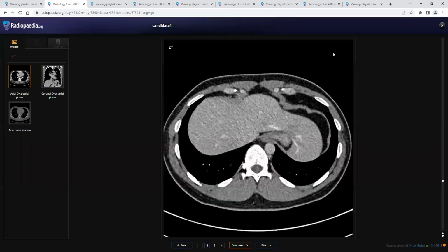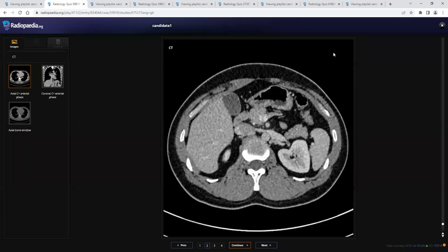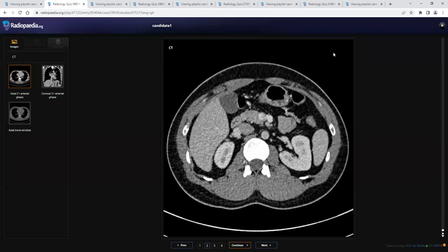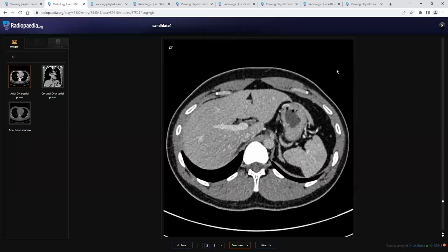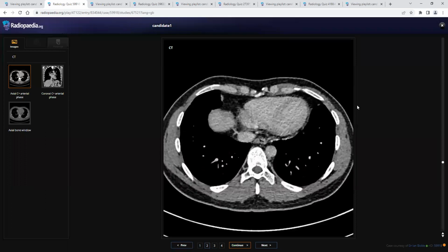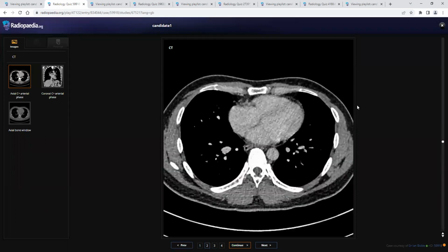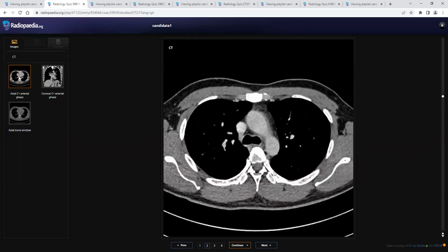In this case, there is no evidence of splenomegaly, the upper abdominal cuts appear unremarkable, and the adrenal glands and kidneys also appear unremarkable. In my routine practice, I would like to see the lung window to evaluate both lungs in a case like that. Yes, the lungs were clear.